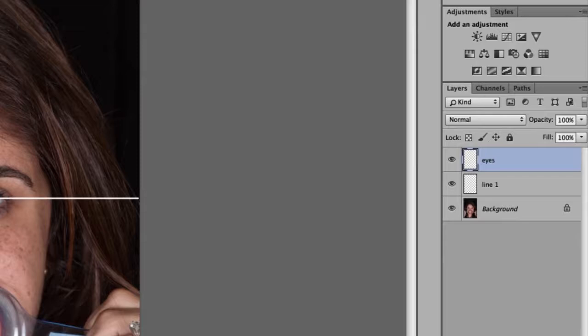And now how are we going to do that? All right, we can do that. We want to rotate her individual layer. So let's go highlight that layer. But when a layer is a background layer, it's automatically locked. You can't do too much to it. We have to unlock that layer. So how you do that, you turn it into a normal layer.